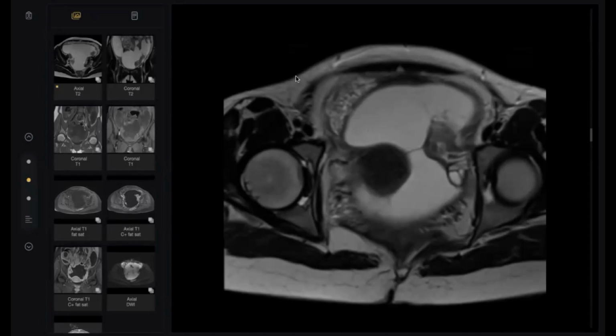So my first differential is TB, peritoneal tuberculosis. Second is ovarian malignancy, as I can see some nodules and some septi also, and some omental caking. So these features are seen in both. I would like to send the patient for histopathological correlation, for aspiration of the fluid, and further management accordingly. Thank you, doctor, so much.